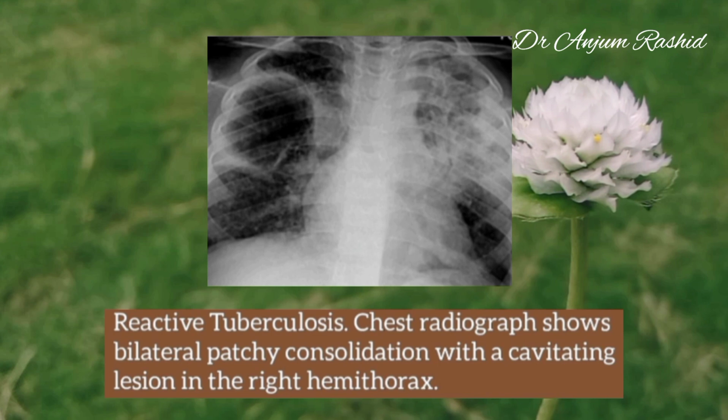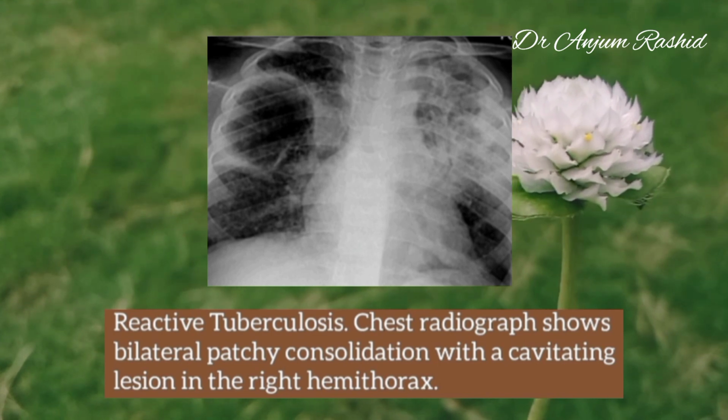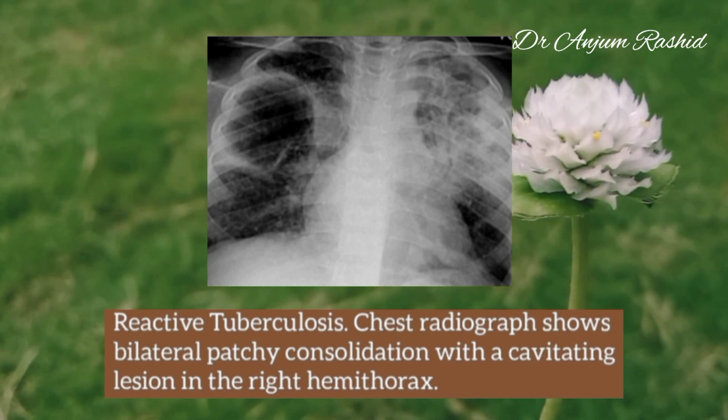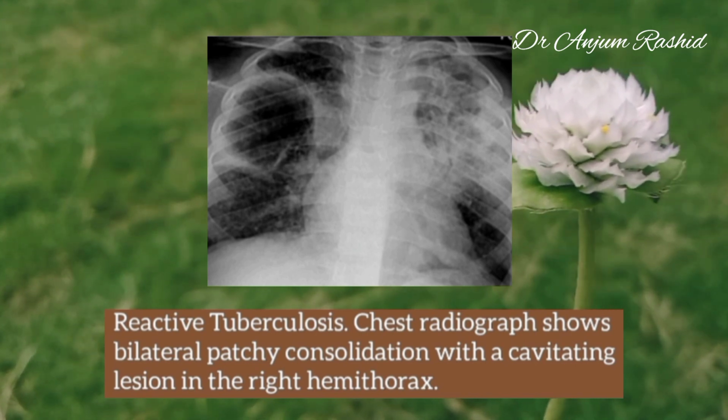Now, this is a case of reactivation tuberculosis. Chest X-ray shows bilateral patchy consolidation along with a cavitating lesion in the right mid hemithorax.